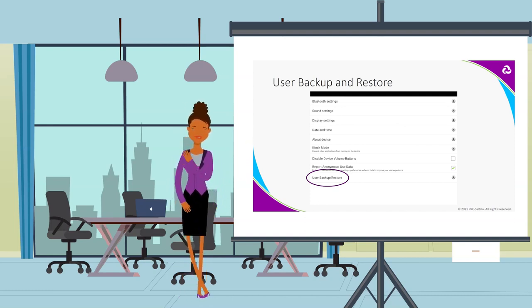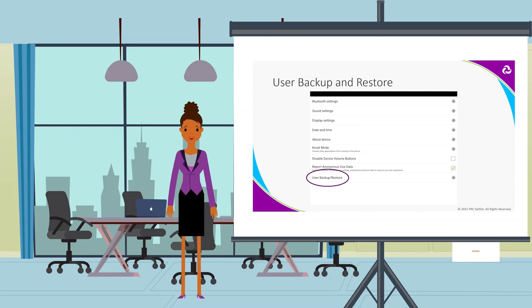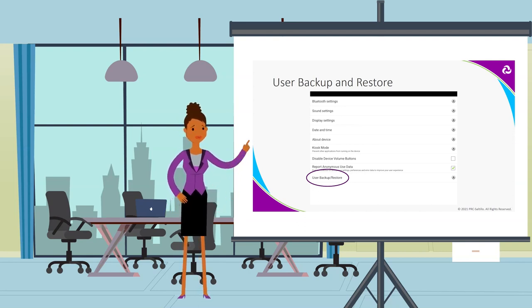For example, you are trialing a NovaChat. You have created a customized vocabulary, added pronunciations, set up button timing, and created profiles. At the end of the trial, the team decided to purchase a NovaChat, and now you have your new NovaChat. You can now transfer all that work you have done on the trial device to your personal NovaChat with the User Backup and Restore feature.